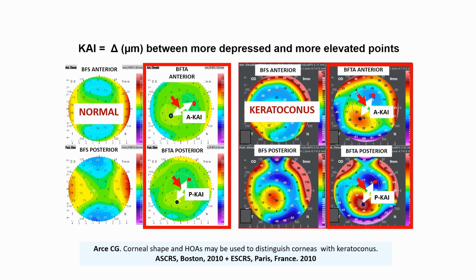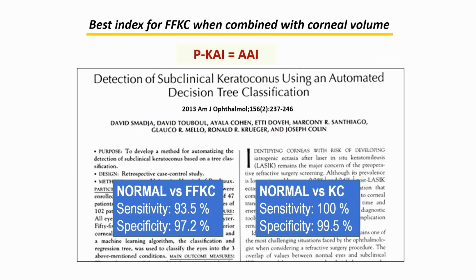And in keratoconus it is very evident, because this exactly will be the coma map in diopters. Okay, the yellow at the bottom, the blue at the top, showing you that the cornea is already sinusoid, like an S, depressed at the top and protruded, going forward, at the bottom.